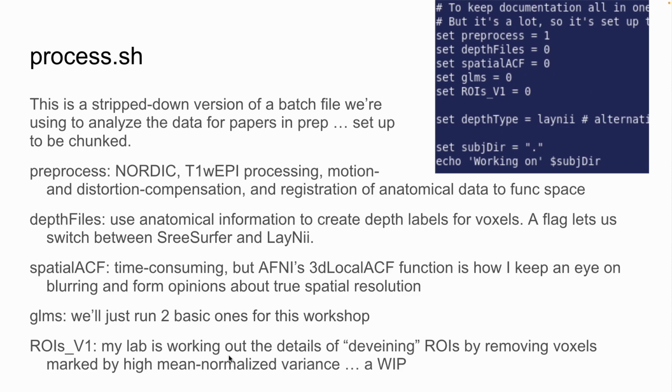It's always 20, 21, how do you count the top and the bottom, but 20-ish equivolume surfaces, and then made a map, translated those surfaces back into volume space, so I had like 20 different volumes showing just the ribbon of voxels that would intersect with each of those surfaces, and then just averaged them all together to create a single volume that has a floating point number in it for a relative depth from 0 to 20. And I never scaled it back from 0 to 1, so that's super awkward. It goes from 0 to 20, but we don't care.